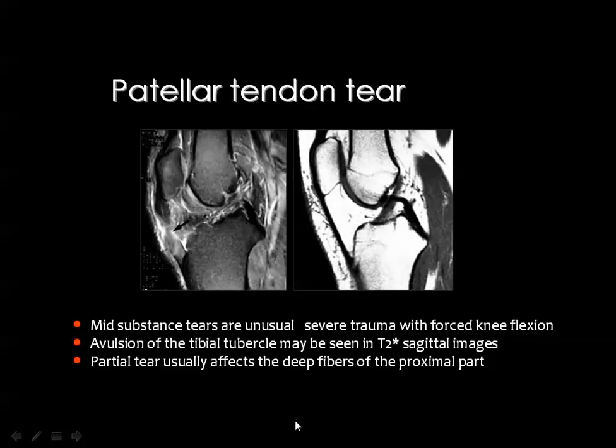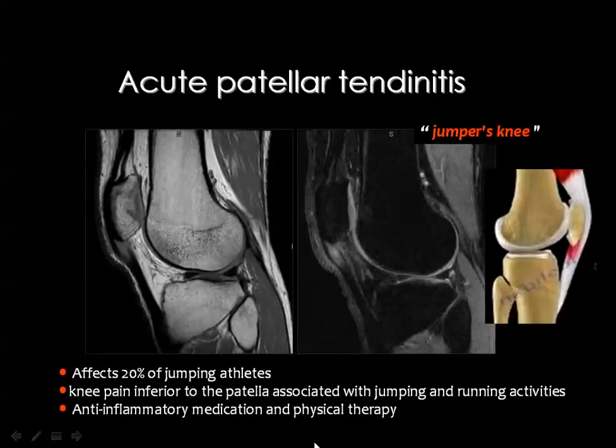This is an example of rupture of the mid portion of the infrapatellar tendon with a swelling of the tendon, diffuse increase of its parenchymal signal intensity, and the fluid signal which is seen at the site of the rupture. You can appreciate this if you compare the torn tendon with the normal appearance of the infrapatellar tendon, which here is intact, surrounded by fat, and showing normal appearance.